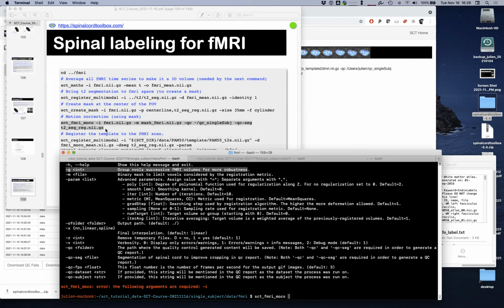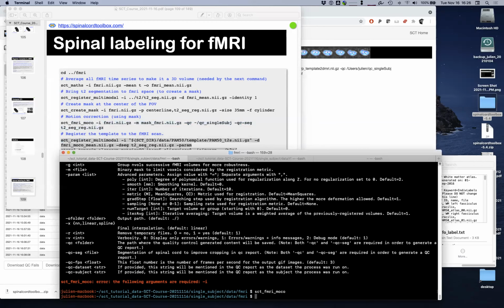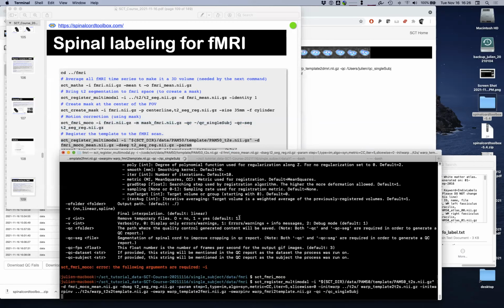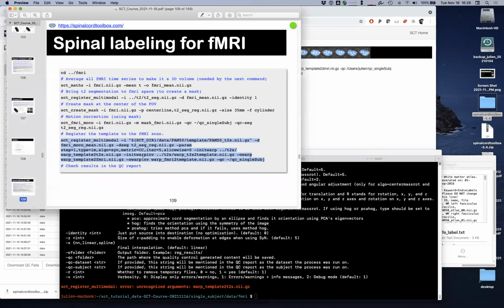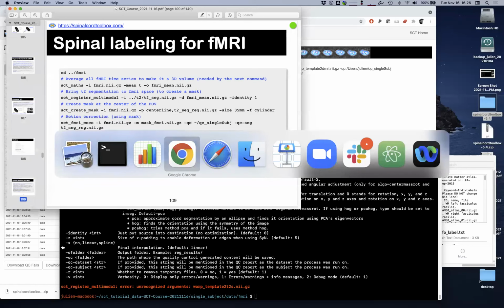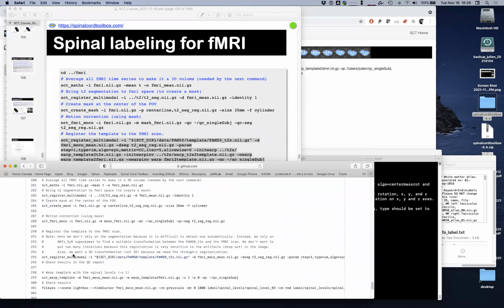Okay. Right, so now that we've done this, I'm gonna run this, and then we can look at the results. So I think, Lisa, that's exactly the error you had, right? And the reason I'm getting this error is because I copy-pasted from the PDF. And if I copy this from the file on the browser instead.